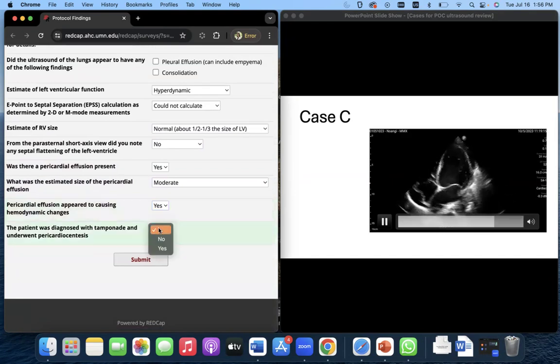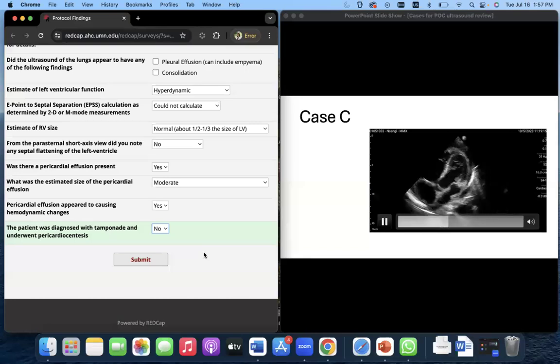Most of the time, the answer to whether there will be a pericardiocentesis will be no, because oftentimes it's difficult to get that done, but it has been arranged before. Depending on your degree of concern, in this case we'd probably say the patient is under-resuscitated, so give more fluids. We've got an A-line pattern and some hemodynamic changes. Exactly what the pericardial effusion is from is going to require some clinical decision-making going through the history.